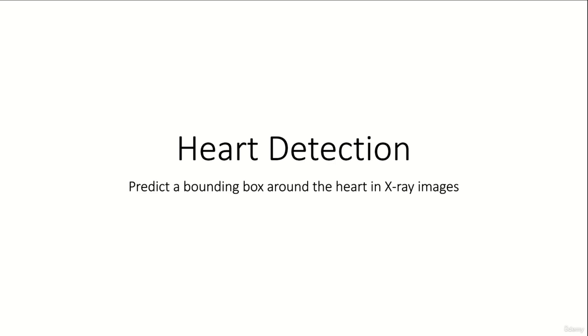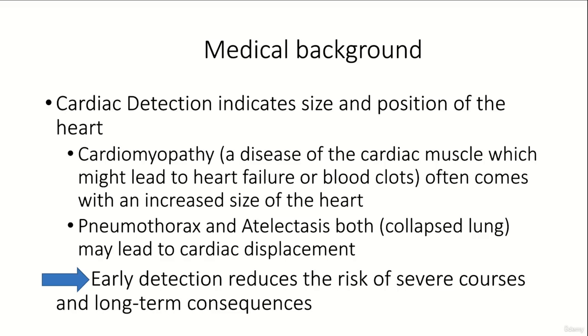Hi everybody and welcome to the introductory lecture of the Cardiac Detection Project. In this lecture you will create and train a model which outputs a bounding box around the heart in X-ray images. As we already did in the last project, let us briefly talk about the medical background.